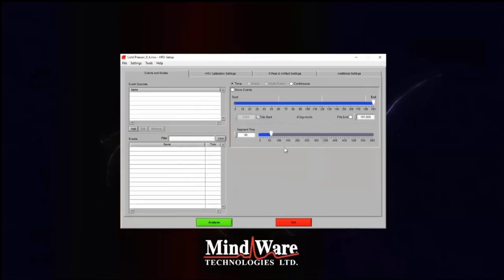Okay, so that alert that you all just saw was basically telling us, hey, this file is different than the last file. If you wanted to look the same amount of time, that doesn't exist here. So it's just sort of an alert. It also comes up if there are events in one file that aren't present in the next one. It's going to assume that you're just editing data for a study and everyone should have those events. And so it's a way in which we can let you know if one is missing.